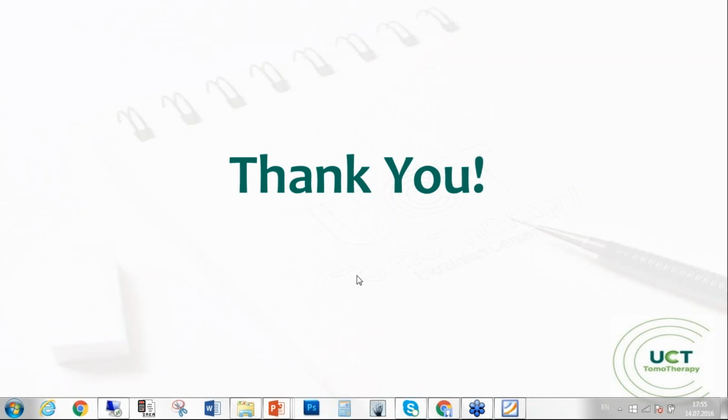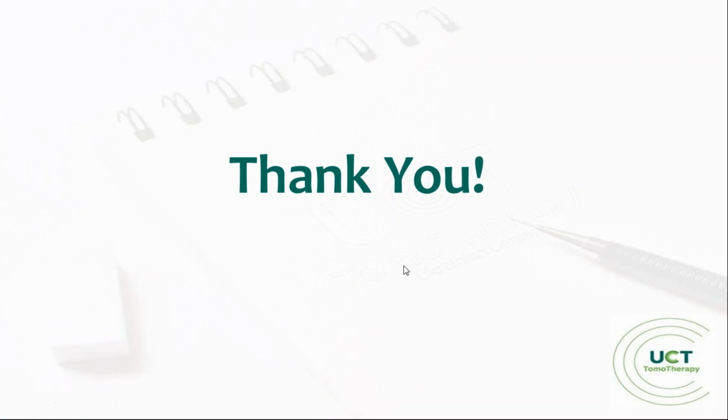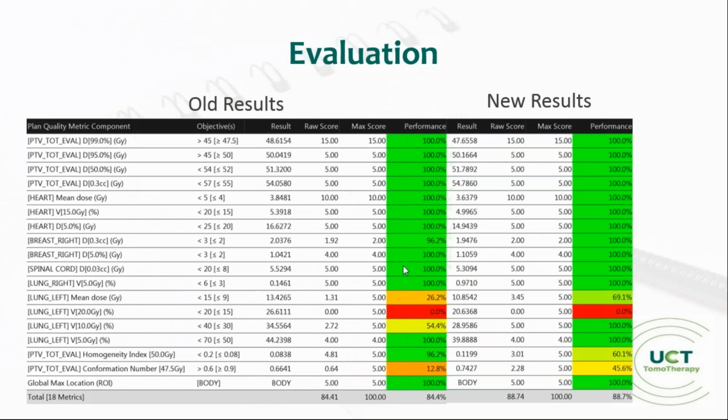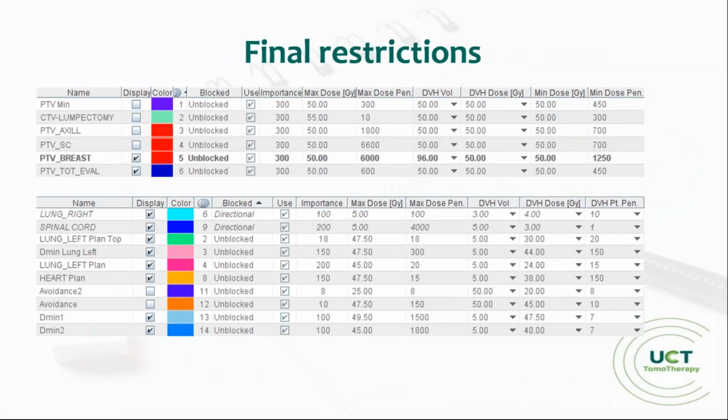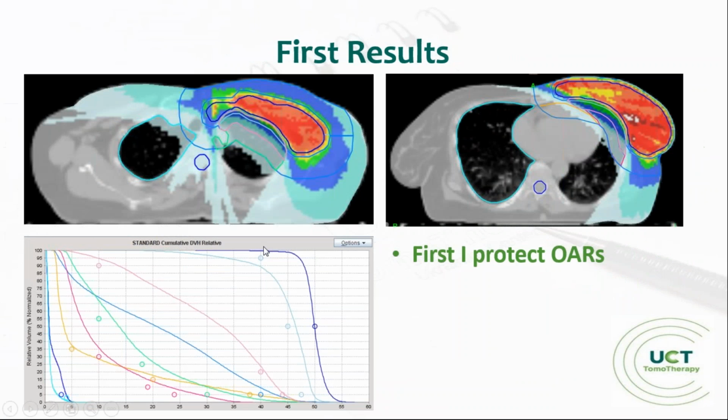I think when you talk about 50%, you are controlling the mean dose of the target, right? Yes, first of all, I want to create a steep dose, and this dose should be homogeneous, so I can push from this side and also from this side.